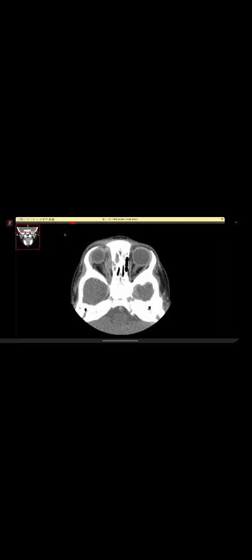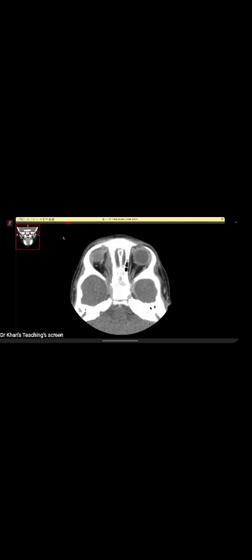The superior ophthalmic vein on both sides appears unremarkable. The cavernous sinus actually shows comparable signals on both sides. I would like to see the bone window images, and based on these findings, okay.